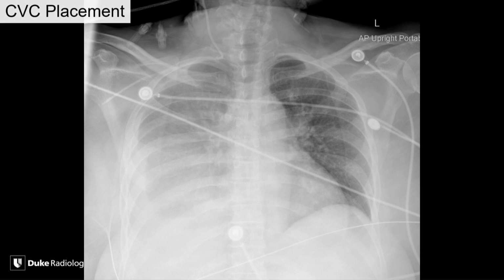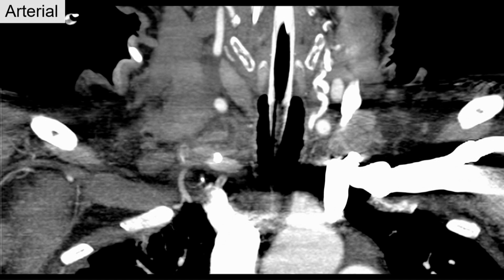Good idea or bad idea? Bad idea, right? I said, you better hold on. I agree. I think it's probably arterial. It's arching well above the scalene tubercle here, probably going out the axillary artery, but there's no way you're going to be able to hold pressure on that. This needs to be removed under controlled circumstances. They consulted vascular surgery. Let me see if I can go through here. They wanted a CT first. There's the catheter.